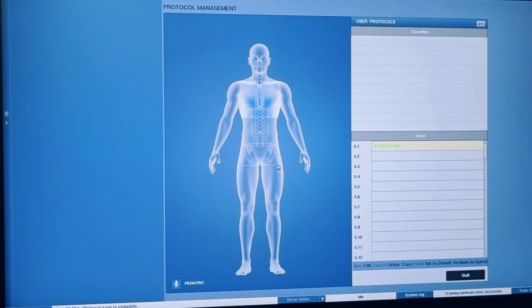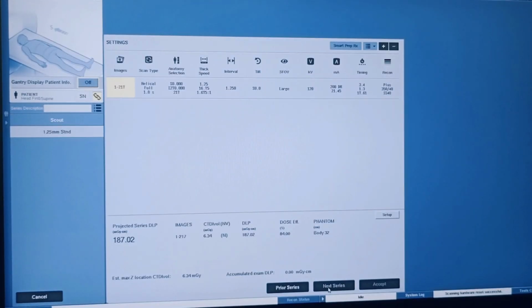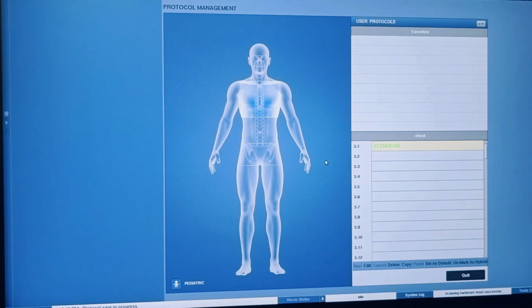लंग्स में HRCT भी डाल रहे हैं, बस वो रूटीन वाले। अपने को तो सिर्फ रजिस्टर एक्सियल भी सेट करना है या नहीं करना? ब्रेन एक्सियल अभी कोई करता ही नहीं है, हेलिकल ही रहता है। पहले जब पुराने स्कैनर होते थे, उसमें हेलिकल में रेजोल्यूशन अच्छा नहीं मिलता था, बट अभी अच्छा है। पहले फिल्टर बैक प्रोजेक्शन था, इतना अच्छा इमेज नहीं आता था, बट इसमें अभी ठीक है। नेक्स्ट है चेस्ट हो गया अभी, और क्या?